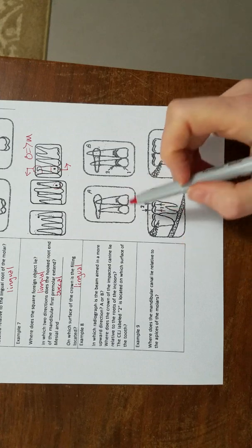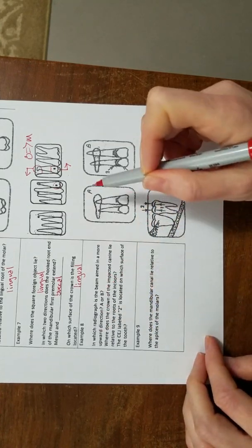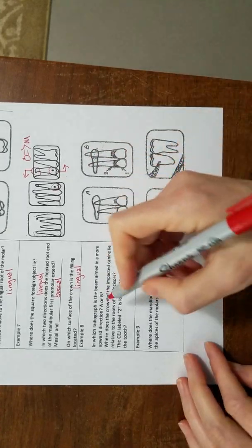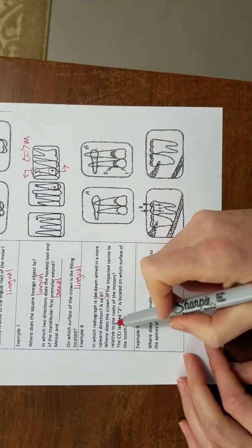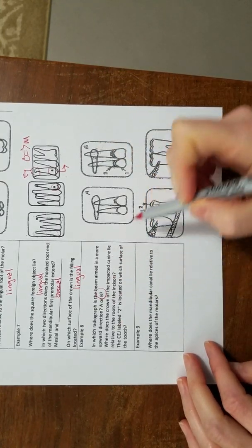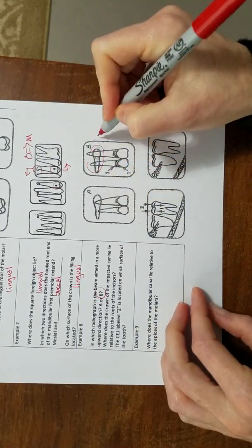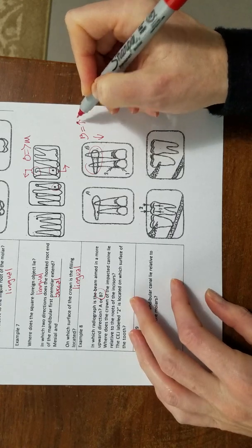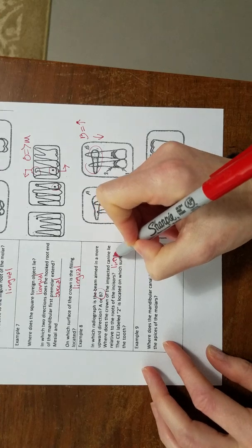Okay, and then in which radiograph is the beam in a more upward direction? In this one the roots are elongated, so it must be B, because the roots are longer in B. Where does the crown of the impacted canine lie? Well, when the beam went up, this crown moved down. The beam went up, and this crown moved down. So then this must be lingual.